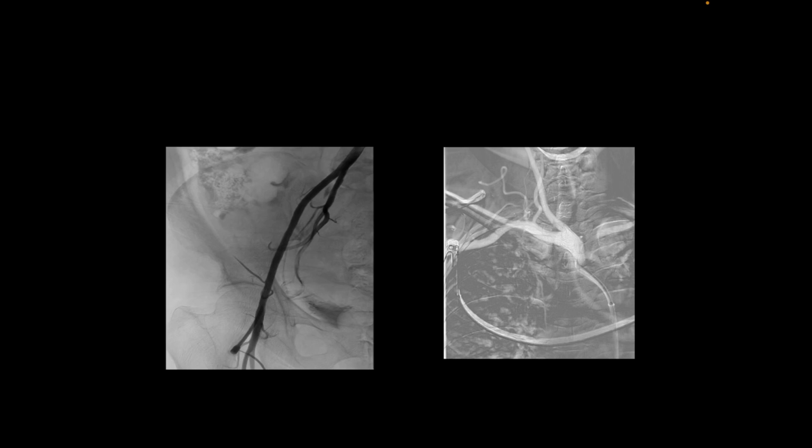Read the angio. This is right femoral puncture. So what do you think about the femoral puncture? This is the head of the femur. Yes. So this is the femur head. Yes. So you divide that into 3 parts. Usually the femoral artery will come somewhere between the junction of the middle 1/3 and the medial 1/3. Yes. And this is a normal bifurcation. It is not a high bifurcation. So you can see the bifurcation here. So this is the femoral artery is lying exactly over the femoral head.